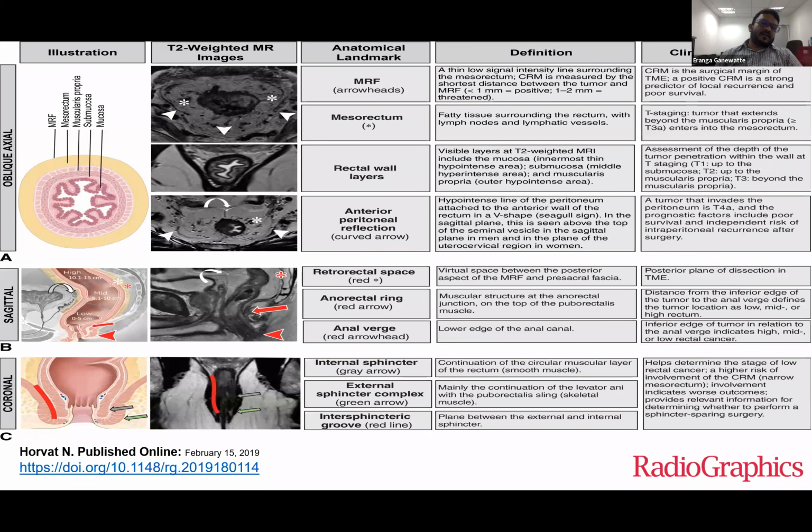In the mid and upper rectal tumors, you have to see where the lesion is. We generally tend to report it along the clockwise where the location of the tumor and the length of the tumor, that is the craniocaudal extension of the tumor and extension into the mesorectal fat. If you look at the first MRI image on T2 weighted MRI image, the stars demonstrate the mesorectal fat. The fat looks hyperintense, that is white on MRI.